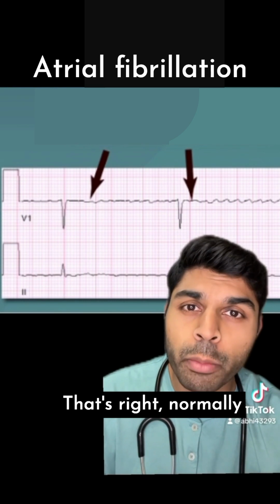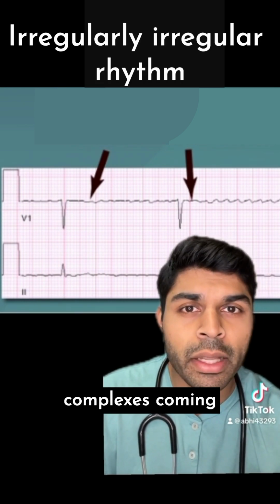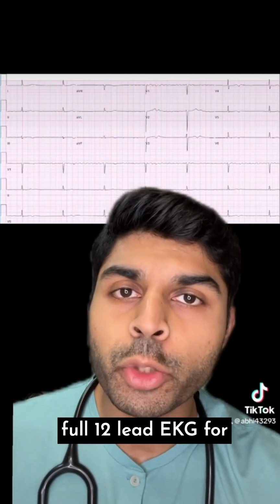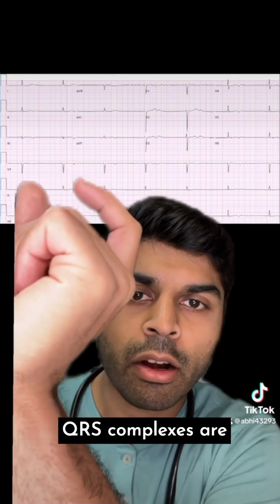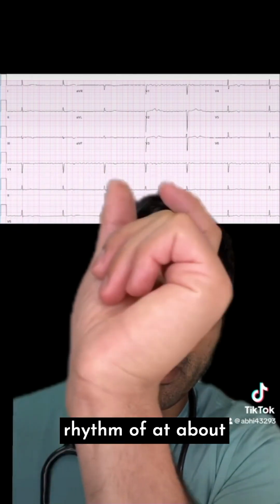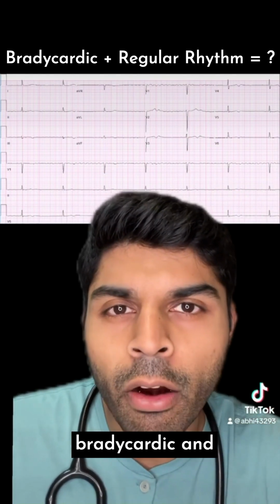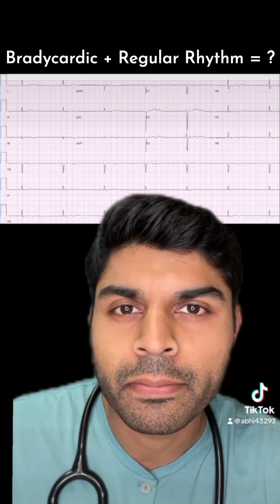That's right. Normally we would see an irregular rhythm with QRS complexes coming in at varying RR intervals. Looking back at the full 12-lead EKG for our patient, however, we see that the QRS complexes are coming at a regular rhythm of about 40 beats per minute. Now, what does a bradycardic and regular rhythm mean for our patient in atrial fibrillation?